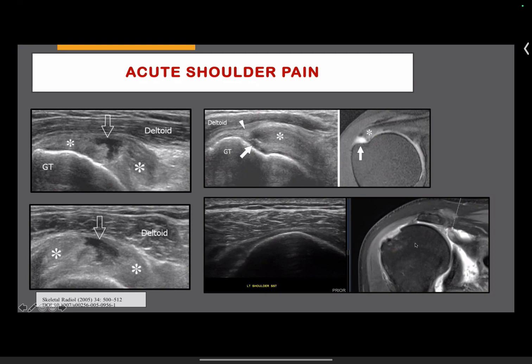You can do an MR if the surgeon wants it. Sometimes MR can be the starting point, and you can see the supraspinatus tendon has retracted up to the joint line. This is too far, I think, to be pulled back. It obviously depends on the age of the patient and the functional status, and the surgeon can then decide whether to leave it be, or to do a replacement, or to repair it. But most commonly, we see these in young people, at the insertion, which can be picked up nicely on MR, but similarly on ultrasound as well. All we are looking for is a fluid-filled cleft, discontinuity of the tendon. So cuff tear is much more common.